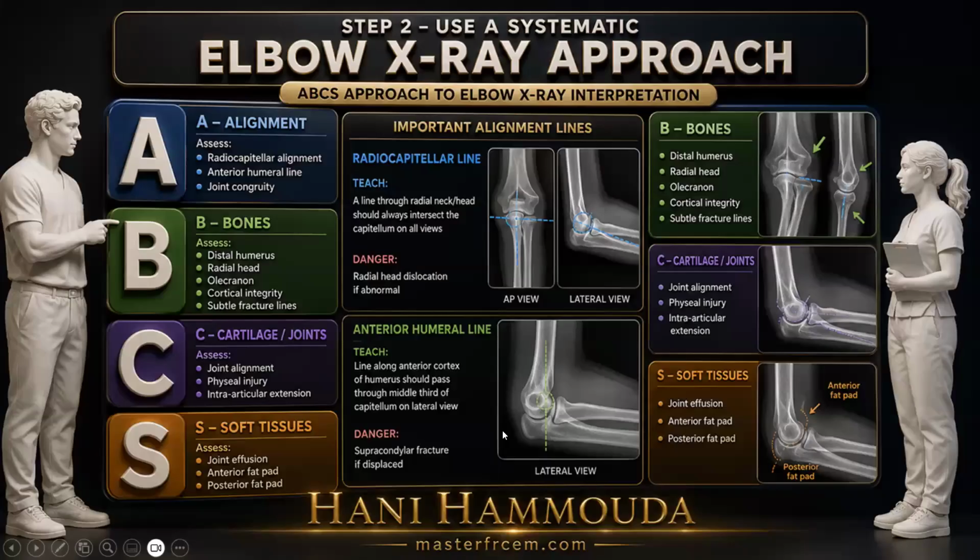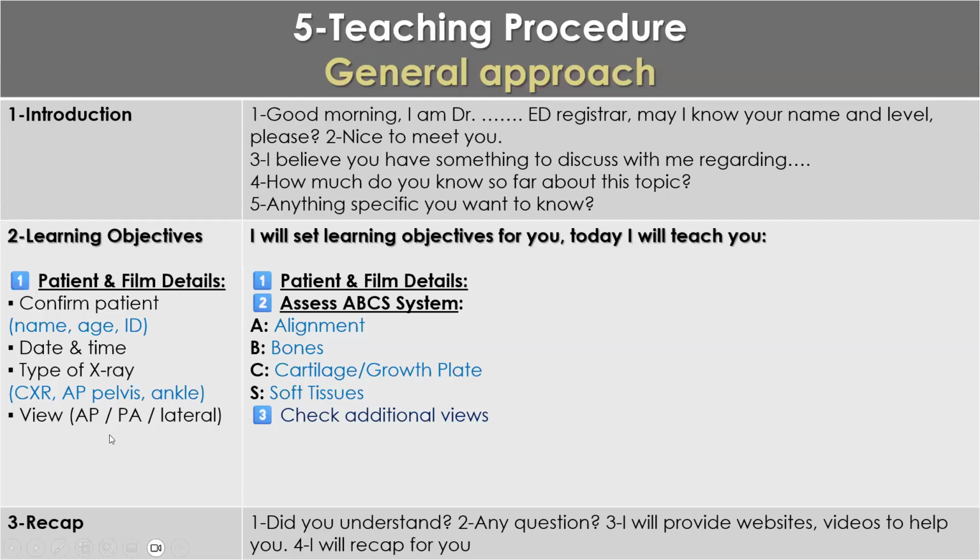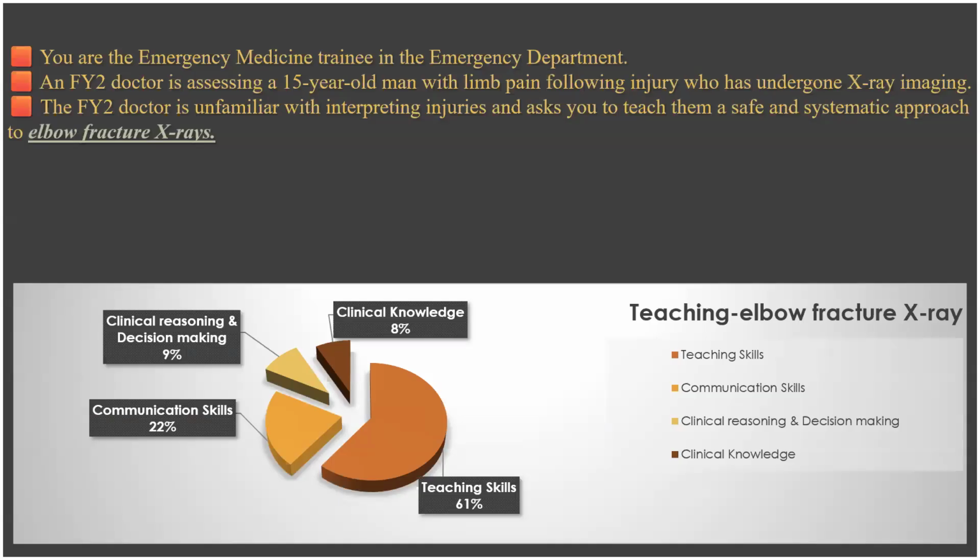What about additional views? So you have an AP view or PA view, lateral view, like that. Okay? You have 30 seconds and 6 minutes. Yeah. Can I start? You can start, please.